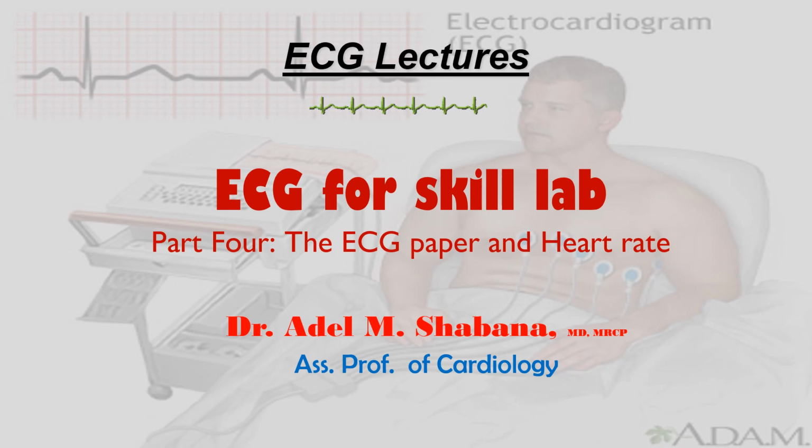Hello, this is Dr. Adel Shabana, and we will continue our talk about Skill Lab ECG. Today we'll talk about the ECG paper and the heart rate.